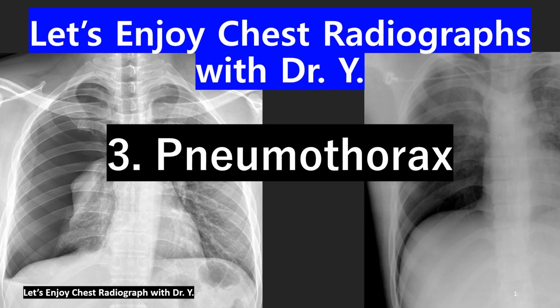Let's enjoy chest radiographs with Dr. Y. Session number 3, pneumothorax.